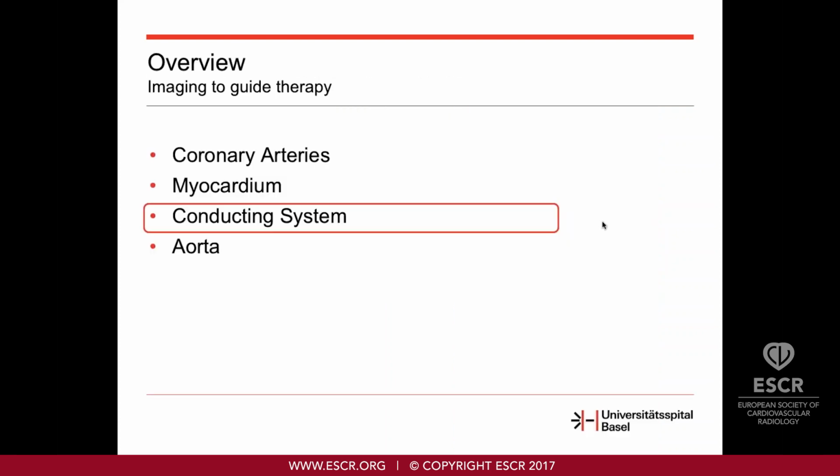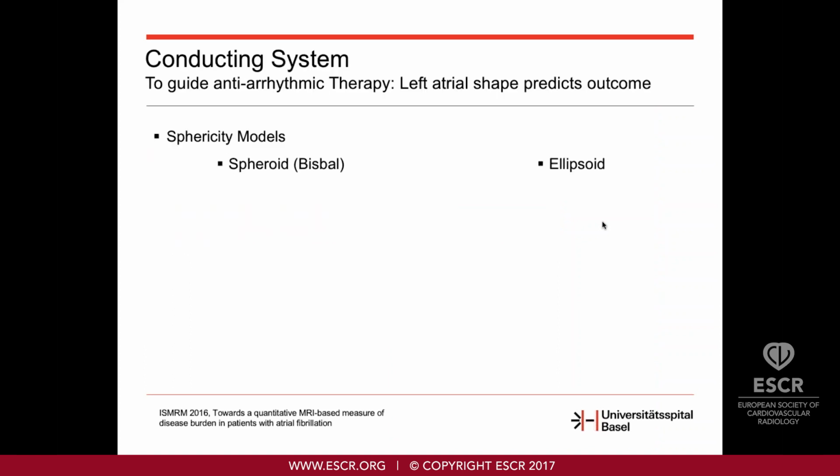We used a different approach. We try to put an ellipsoid into the left atrium. So it's a morphological measurement, and we try to fit an ideal ellipsoid into the left atrium. Here you see this technique that our computer uses to generate an ideal ellipsoid.